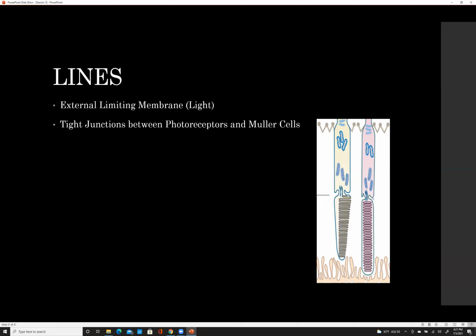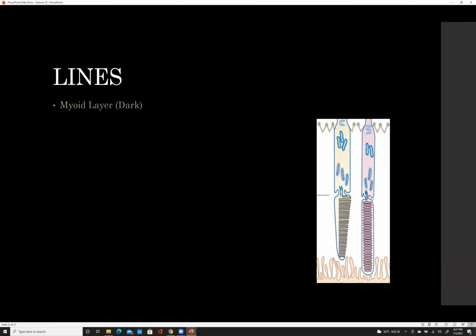It's tight junctions, thus the light is tightly packed together. The word tight is in it. And so thus you get this reflectance pattern where you get a really nice hyper reflective line because the light is bouncing off of it, okay? And so you can see that's the schematic. Make sense? Totally. Good. So now we're going to move on.